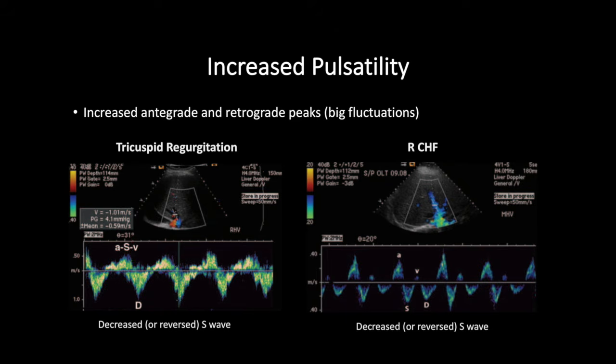Again, that's the minutia. If this didn't make any sense, it's cool that you've gone through it, but again, it doesn't matter. In clinical practice, just recognize increased pulsatility. That's cardiac congestion, a cardiac cause.